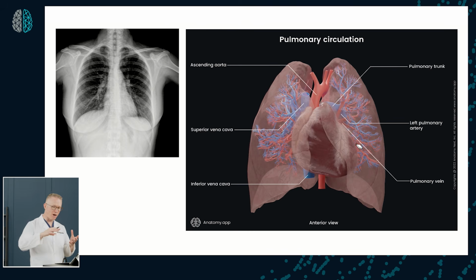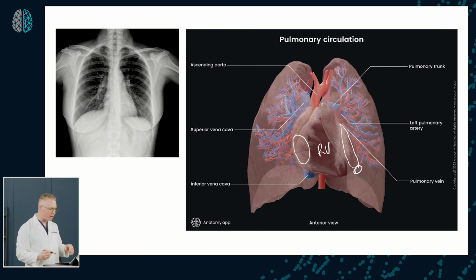It's important to see that the heart is sitting inside and that the lung slightly wraps around the heart. But again, the most anterior portion of the heart is the right ventricle. Your right atrium is over here, okay? The left ventricle portion is over here, and then of course the apex is sitting in this area right here.